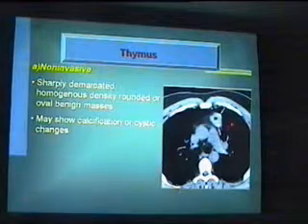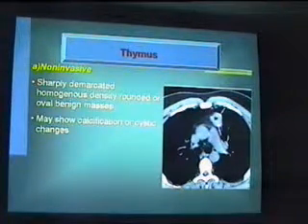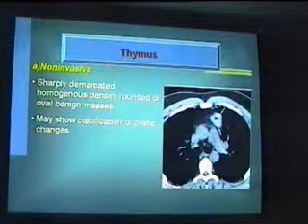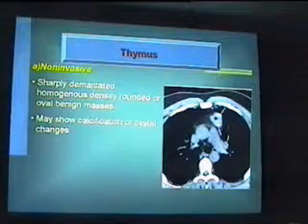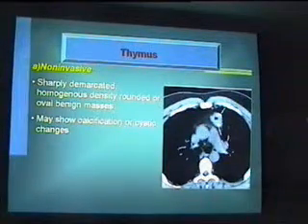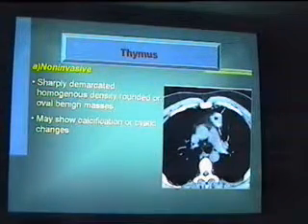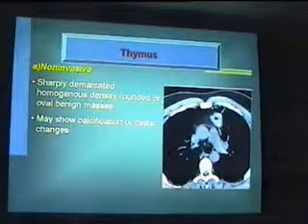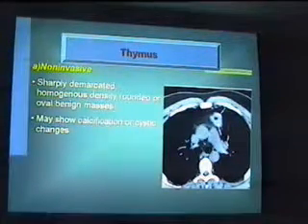حتى هيقول لي طب وانا اشخص دي ليه ثايموما؟ الحقيقه ما فيش اي سبب يدعو ان احنا نشخص دي ثايموما. لما في الاخر خالص هنكتشف ان it's not easy to specify the mediastinal lesions unless they arise from the aorta, from the pulmonary artery, in the region of lymph nodes او معهم pathology في السباين، لكن otherwise it's not easy to get out the definitive diagnosis.